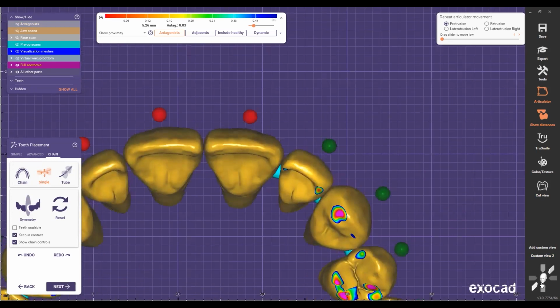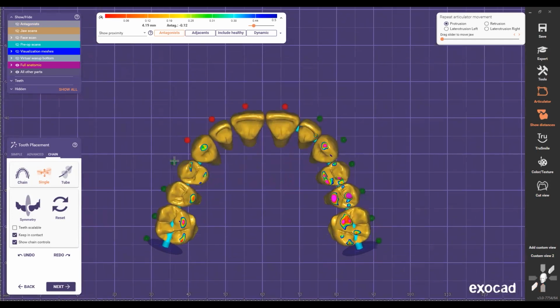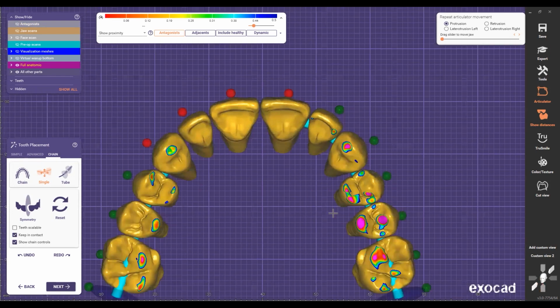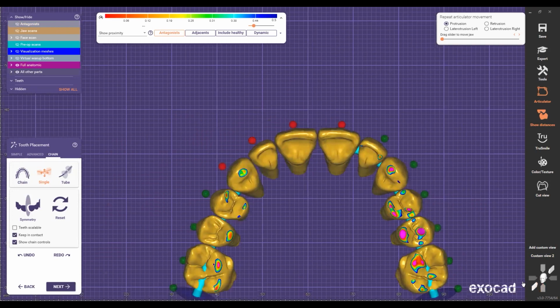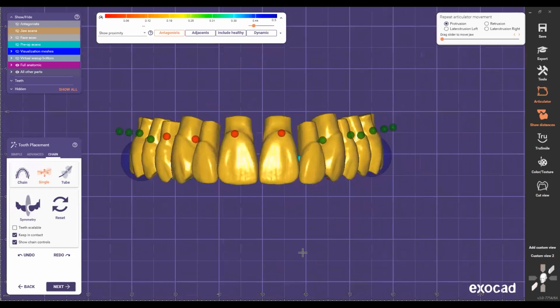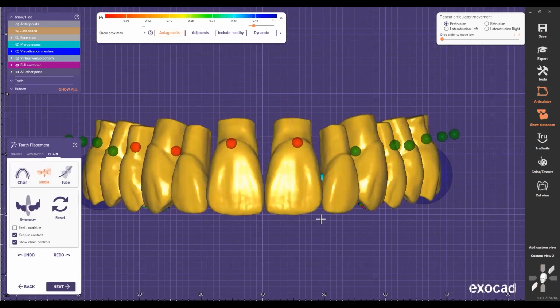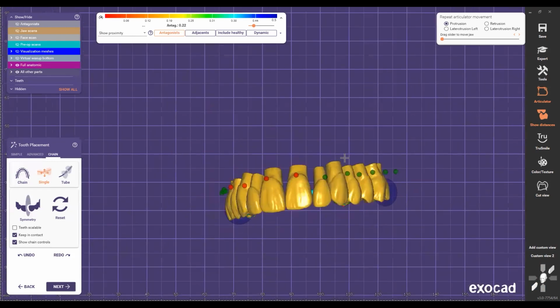And I wanna make sure that I follow a nice curvature here of the buccal incisors and buccal cusps. They're lining up, and then also the fossas and the lingual cusps, and then the incisors right here. So now I can see that this looks good there, and in the different views. So the way aesthetically it's gonna look nice in the face. So I go closer. Now I just start moving this a little higher right there. And I'm looking for these V's right here to make sure that it's gonna look beautiful in the face as well. So now I can just jump to lock this tooth.